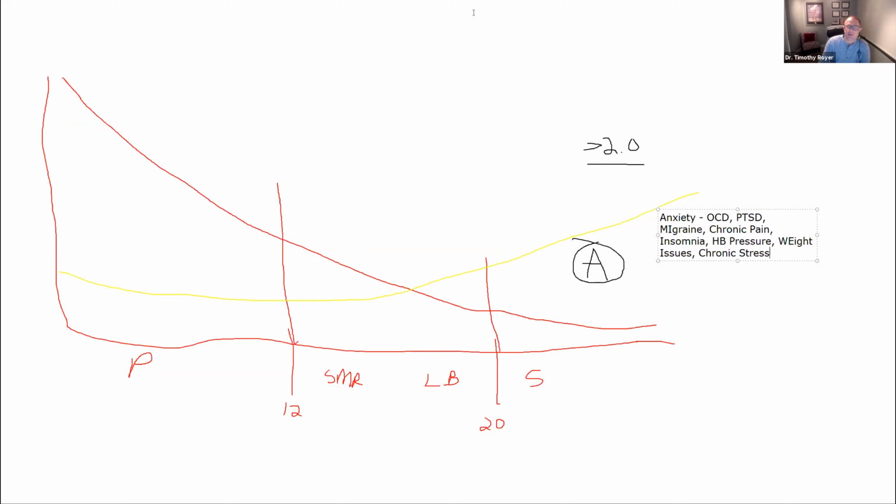The flip side of it that I want you to look at over here is, notice the yellow line is low here, meaning that instead of these slow frequencies having nice high amplitudes, like we looked at earlier, they're actually very shallow. They're still cycling the same time, okay? So like a 2 hertz is still doing 2 cycles a second, but the height of it is really low.